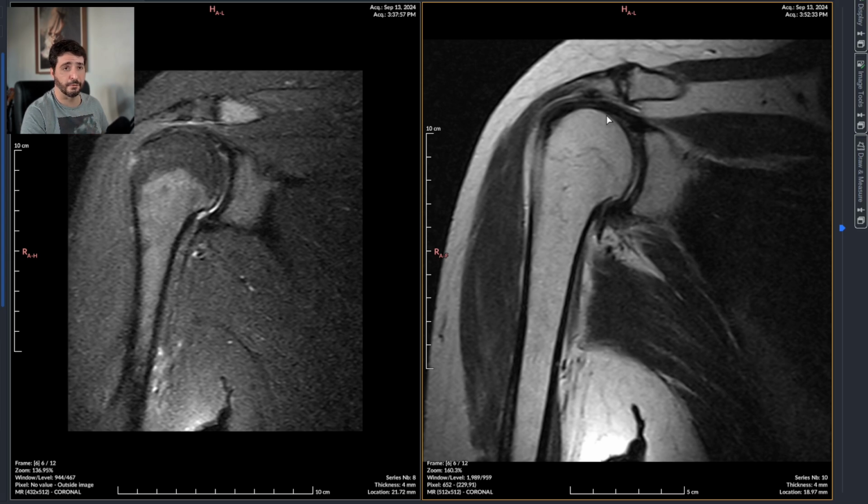This by itself could be a motive for a painful shoulder. So this is painful in itself. It could be enough, just this. But we can go further, we can look for other common signs of a painful shoulder.